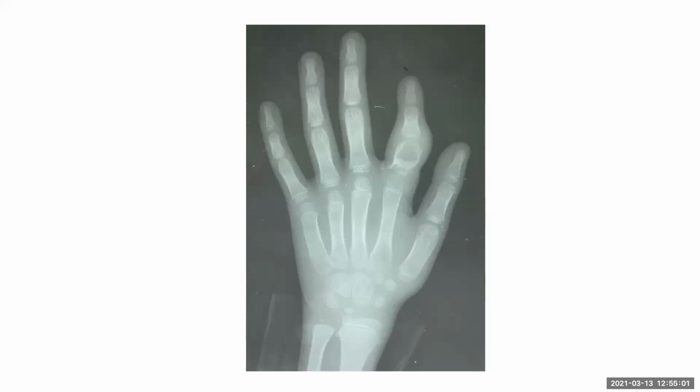As this is a young child, I'm more worried about tuberculosis, so my provisional diagnosis could be spina ventosa, tuberculosis causing this lesion. Other differentials: as this is a young child, LCH, eosinophilic granuloma, is also in my differentials.